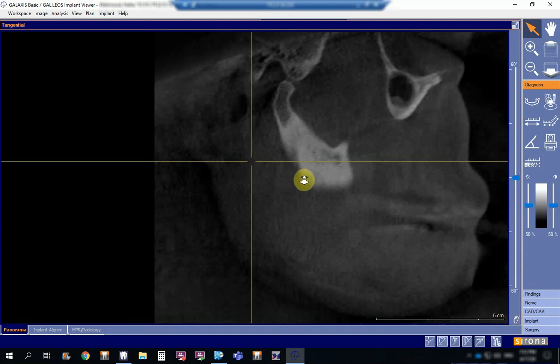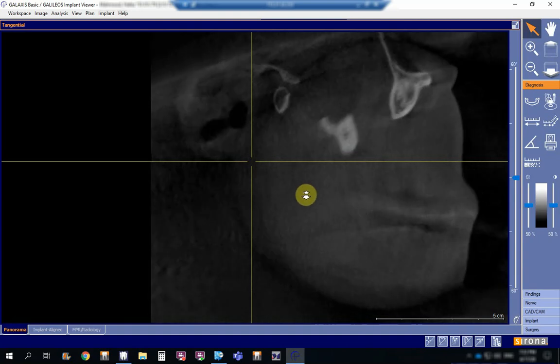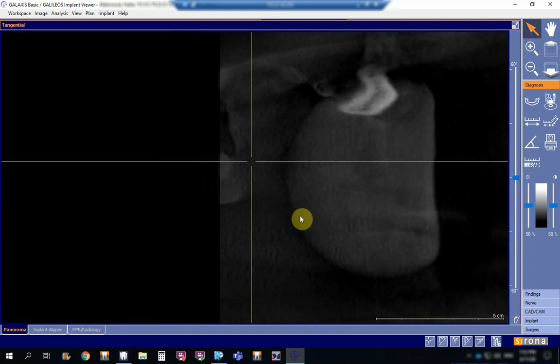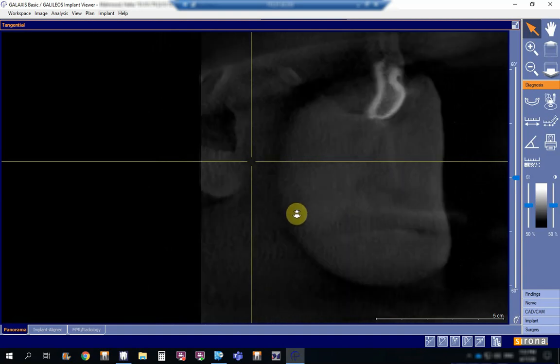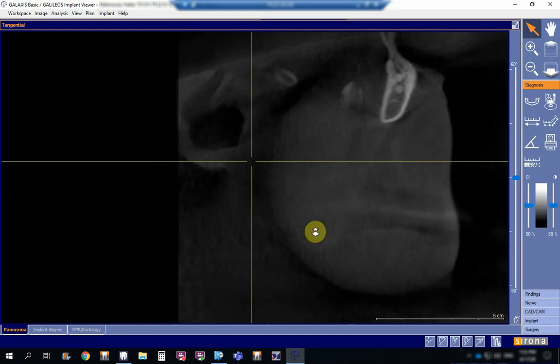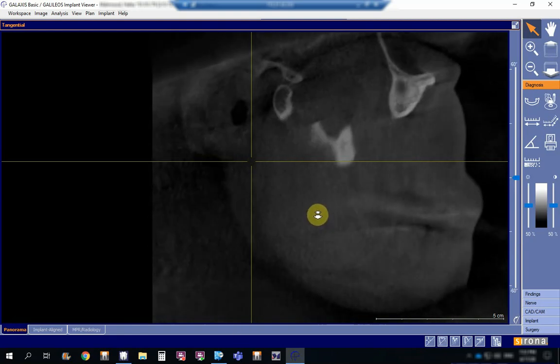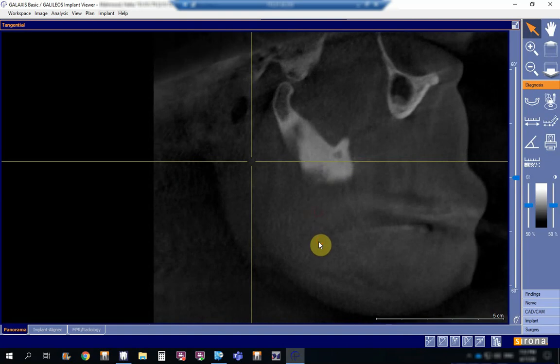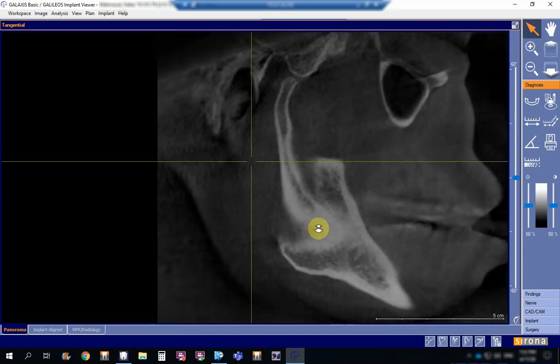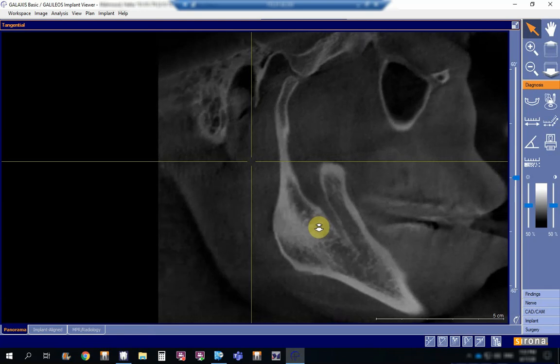This is the farthest that I can go in a lateral direction, the farthest side I can go in the coverage, and then I will go in a medial direction. You see, I'm going medially now. Now we have gone through the mandible, as you can see in here.